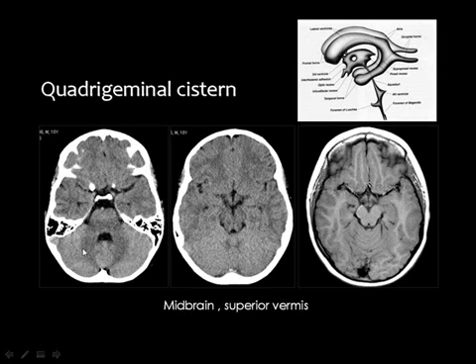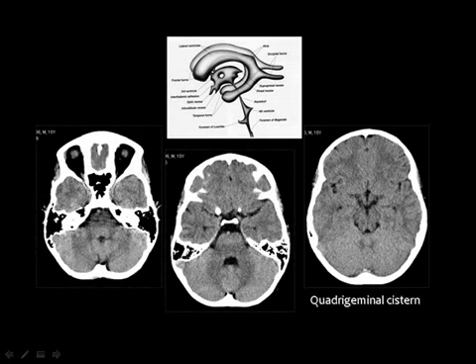You know, this is the fourth ventricle, which is large, then this is the pons. And this is the fourth ventricle, which is small, then this is the midbrain because you are in the higher section. Then here are the three levels of the fourth ventricle. The fourth ventricle is large, then this is the pons. The fourth ventricle is small inferiorly, then this is the medulla oblongata. The fourth ventricle is small superiorly, then this is the quadrigeminal cistern, and this is the midbrain.